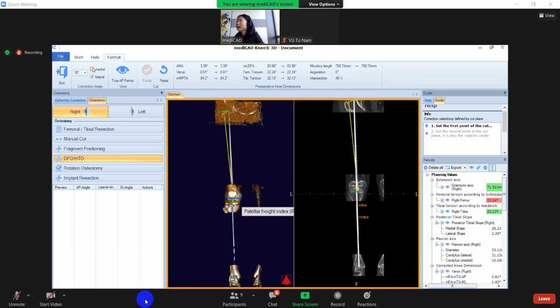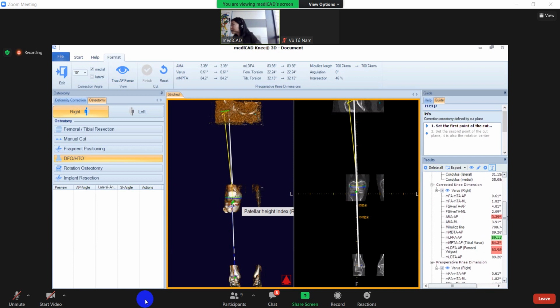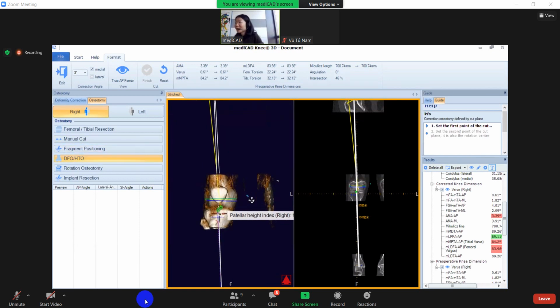Oh, please pardon me. Here nothing changed. There's 0, 6, 1. Just choose 3 degree. Oh, yes. And now, oh, please pardon me. I forgot to set the cut. So, set the first point of the cut.